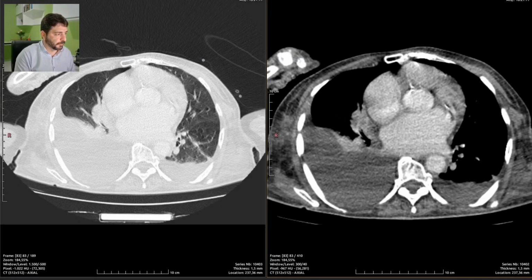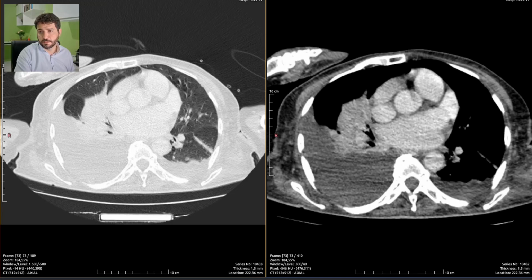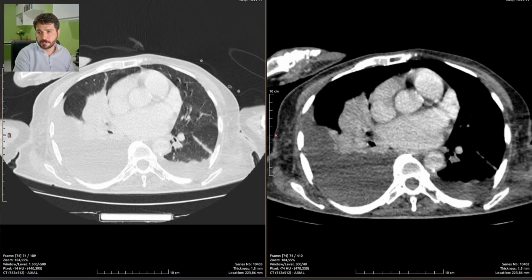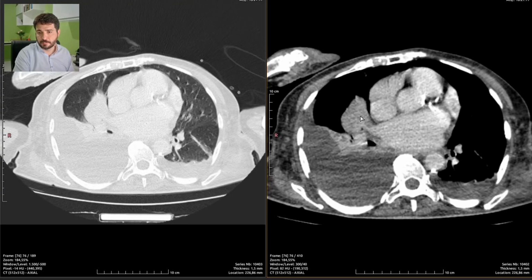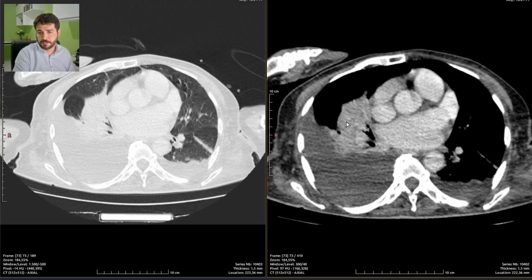Just reporting the pleural effusions and the partial collapse of the right lobe. There is anomalous filling of the airways, so the middle lobe has this aspect, this feature, this morphology of a section of the liver parenchyma. This looks like a parenchymatous solid organ, but this is just a collapsed middle lobe.